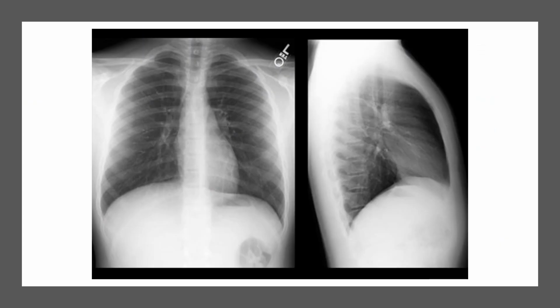So this is a lateral right here. So this is a PA and a lateral, or what you have here. The lateral means they're faced from the side. So this is the sternum up here, and then obviously this is the spinal column here, right? And so this patient's faced over to the side, and so then you can see their main stem. Hopefully you guys can sort of see this. Do you see that black line going down? You can sort of see it go into their lower segments, anterior, posterior, lateral segments. This would be a lateral segment right here. So you can sort of see from the side view as well.